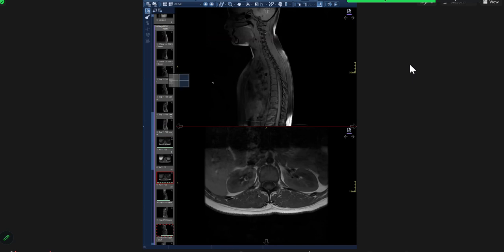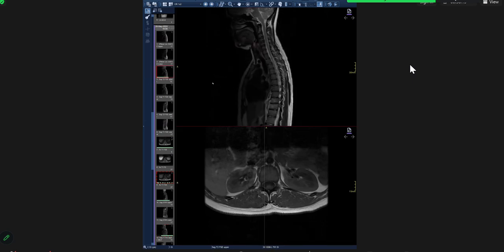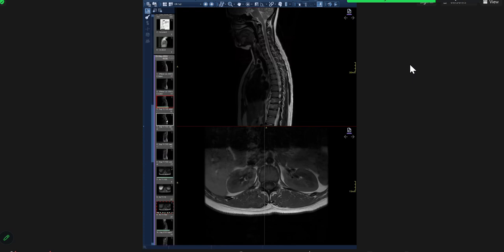Any other question? So disc involvement, I'm not sure. Probably there might be, but even on these images, to say whether there is or there's not is a bit difficult, because the discs above and below appear similar. Here, they look, maybe they're a bit edematous, but it's mostly subligamentous spread of the infection. Any other question? Can we go on?